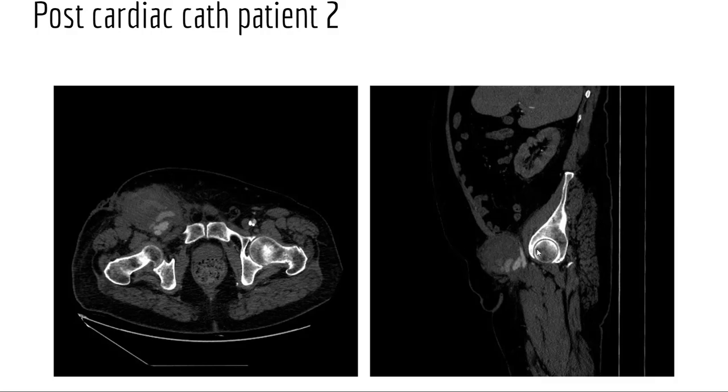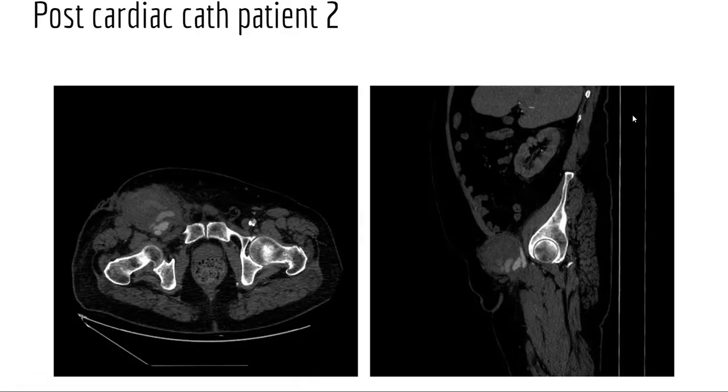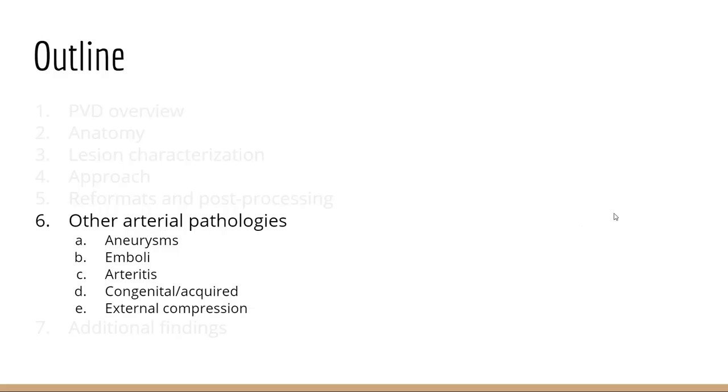Again, this patient from before actually was presenting with some claudication because of a steal phenomenon from this high flow AVM. I forgot about that. So we do see these on call. In patients with suspected claudication from PVD, very rarely will we see other etiologies such as a high flow AVF post intervention. And back to the pseudoaneurysm, this is a growing mass post intervention, obviously pseudoaneurysm which we injected thrombin into.